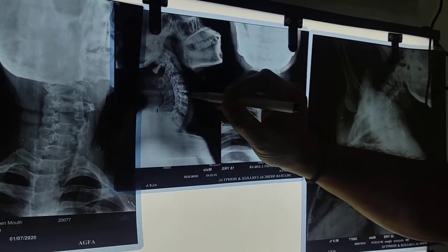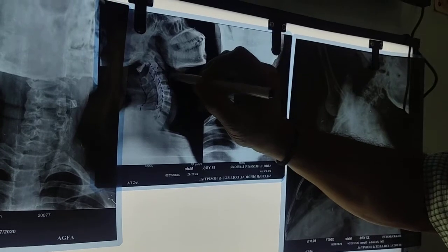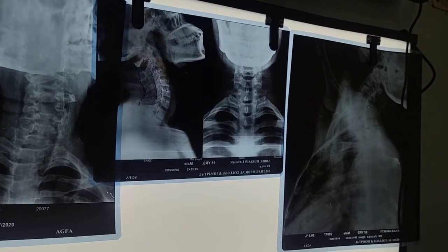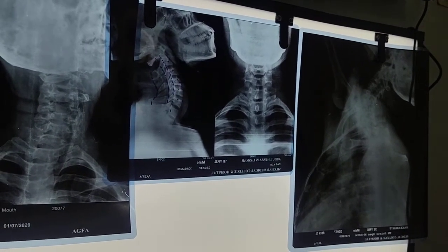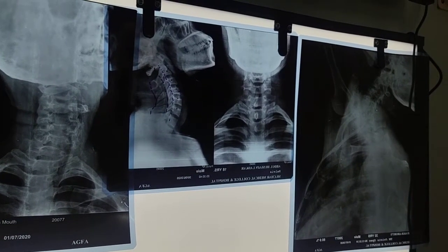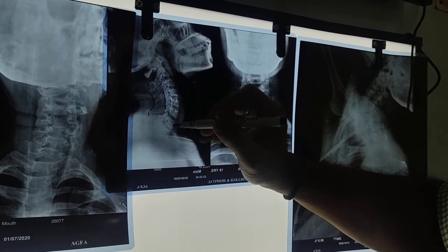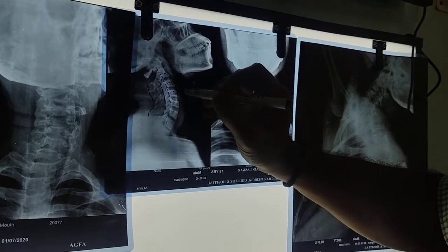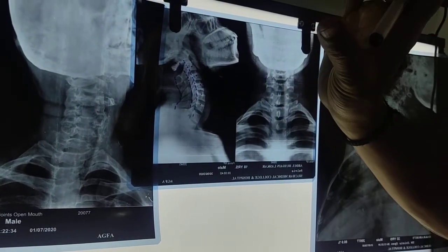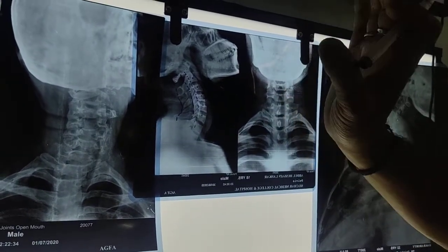Number 2, in the case of the cervical spine also, we will look for the A, alignment. B is your bony part. B is bones, meaning you see the bony component of the vertebra. Here you also see the integrity of all the bony components, the vertebral body, whether it is maintaining shape and size or not. Is there a compression of the vertebra or reduction of the height of the vertebra, or is there translation, whatever it might be.